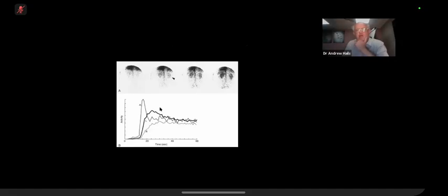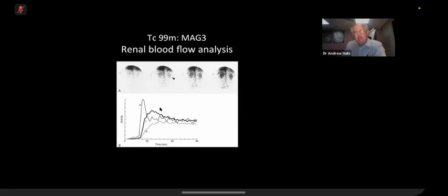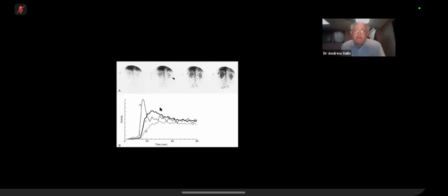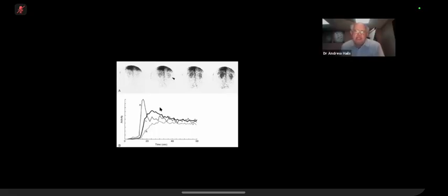Now, we're now on to kidneys. Okay, so I've got a couple of pictures here. Now, I've projected it, could you tell me what you've got here on this screen? Hi, is this a MAG3? Yeah, quite likely. And so which part of the examination is this?